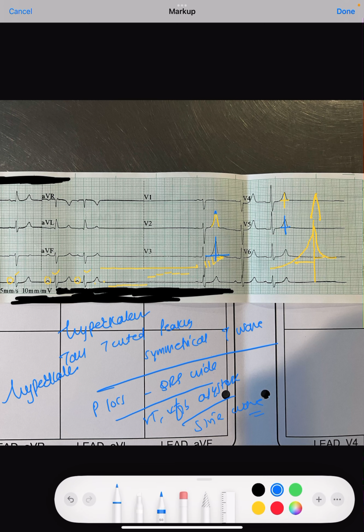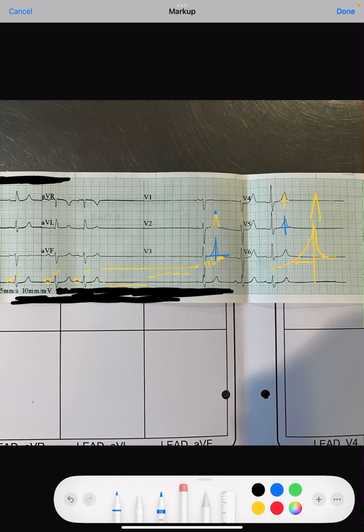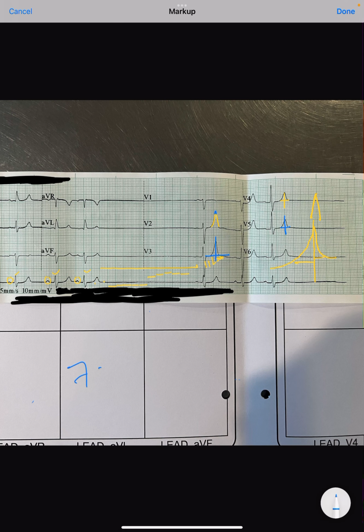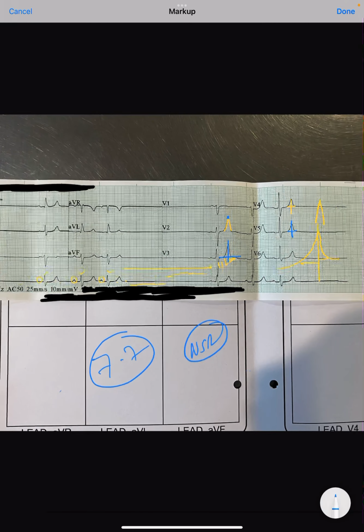This particular patient had sepsis, shock, and hypotension, which lasted for a few hours. The patient landed up in acute renal failure, acute kidney injury, and the patient's potassium was around 7.7, and he was showing this rhythm. After dialysis, this rhythm completely reverted to within normal limits, a normal sinus rhythm, within 2 to 3 hours.